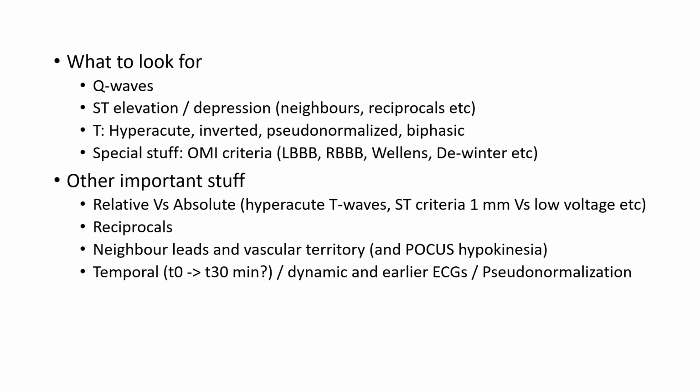Okay, then we also always have to think of the temporal aspect. We take an ECG now that might not meet significant STEMI criteria, but let's take a new ECG in 15 or 30 minutes, especially if they still have ongoing chest pain, right? Then we can see the dynamic changes. We can see the progression or the reperfusion of the ECG, which we would call dynamic changes, right?